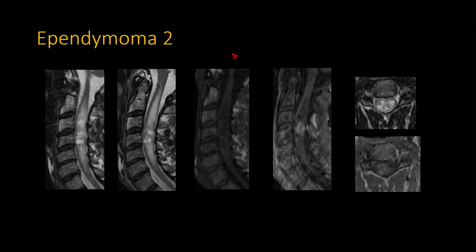Here's another case. This one's not scrollable, these are static images, but I wanted to include it to show that it's not always going to be cystic. Ependymomas have cysts pretty frequently, but it's not universal at all. But again, what you can see in the center of it is this very heterogeneous area that looks like a mass. And surrounding this central mass, even on pre-contrast images, you can see a lot of edema going up and down. So again, this clues you in that you're dealing with an actual neoplasm as opposed to something inflammatory. And this was another case of an ependymoma.